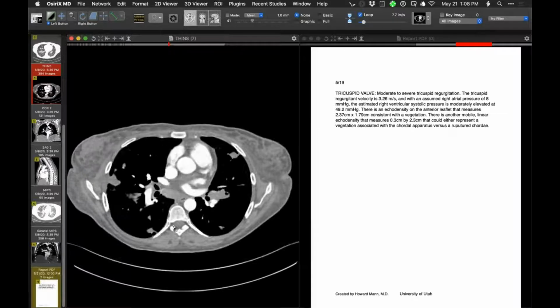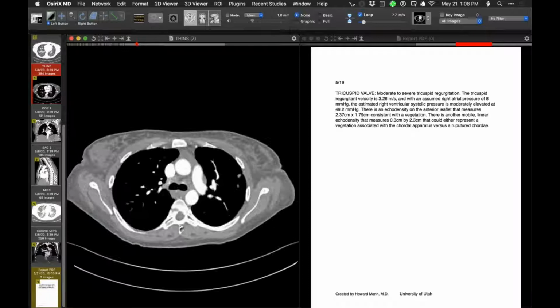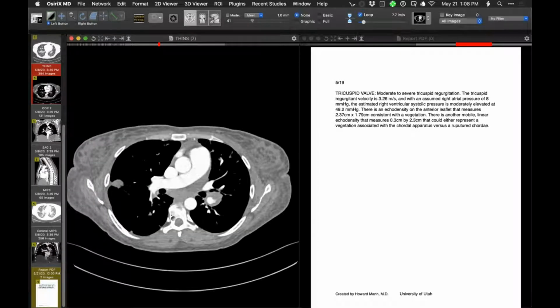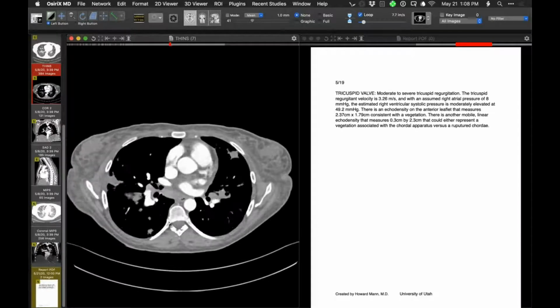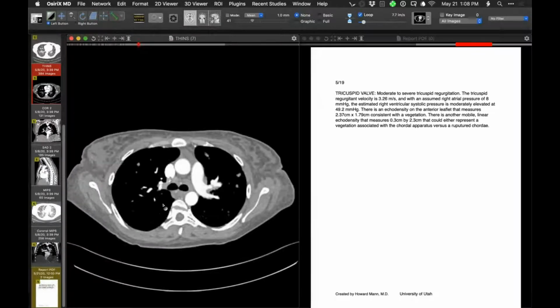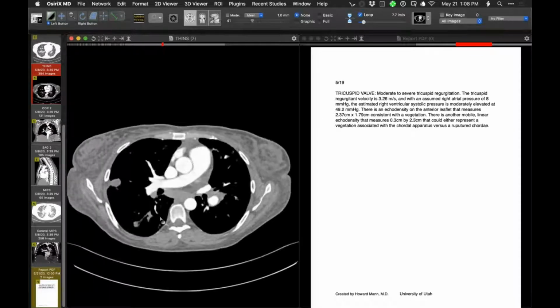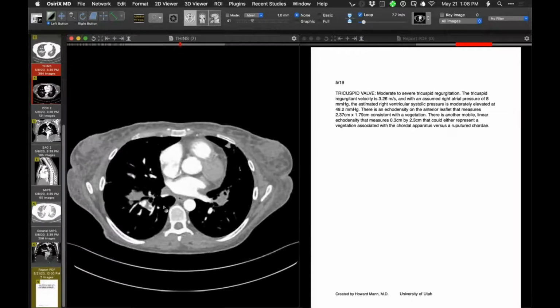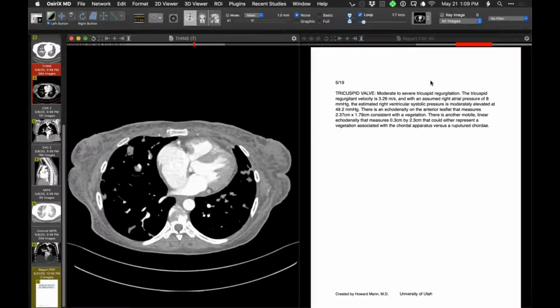Anyone have any other thoughts about that, or are happy with the diagnosis of mycotic aneurysms? I agree with presumably impacted vegetations and complications of impacted vegetations and infection and cavitation and all the above. No, I agree with you, Howard, and that's a very impressive case. Yeah, it is. So obviously the surgeons are reluctant to operate on this patient, but I think they'll probably find someone and do so, because there's a persistent and progressive problem.